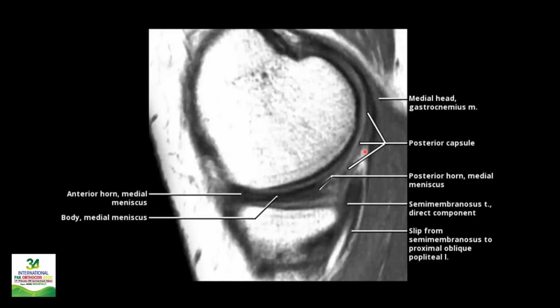We'll be appreciating these in the images as well. Now, these are a few structures, and Dr. Abbas has already discussed them, so I will be passing through these.